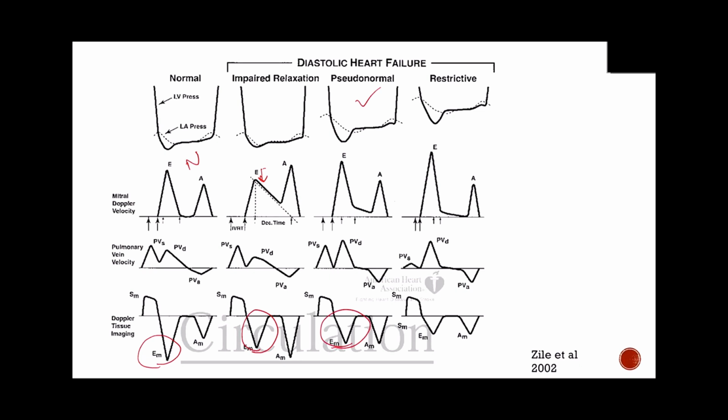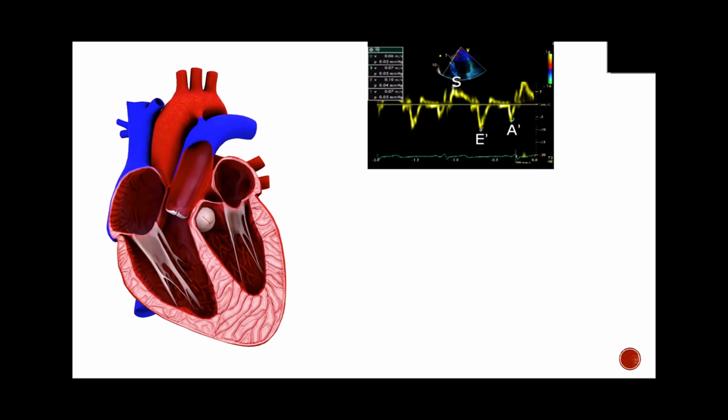So if I'm making a test and I'm trying to see, do people truly understand diastolic dysfunction, wouldn't I focus on this pseudonormal pattern, right? Grade 1 diastolic dysfunction, obvious, right? Grade 3 and grade 4 diastolic dysfunction in a non-healthy person, right? Not your 18-year-old athlete, right? Is going to look much different than normal. And so I would focus a lot on the pseudonormal pattern. And that's where a lot of the criteria for diagnoses will come in. All right. So this is just an example of our tissue Doppler. Again, our S prime wave, our S wave, our E prime wave, and our A prime wave. All right.